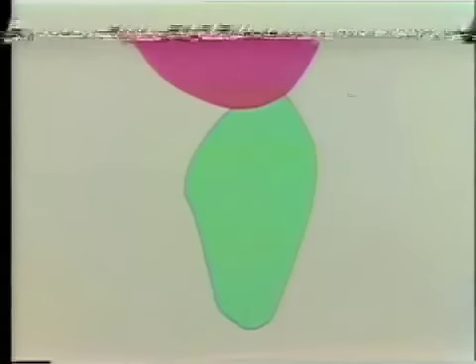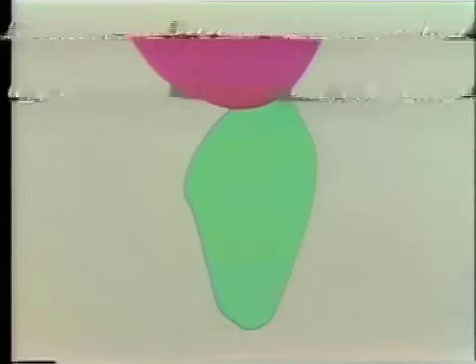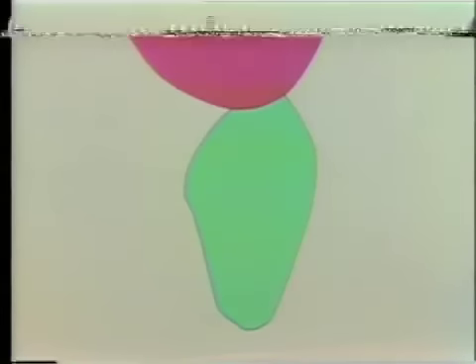Recognizing in this diagram that the right-hand side of the screen is the labial and the left-hand side is the lingual surface, you can see that the Pontic contacts the alveolus from the labial contact just back lingually to the crest of the ridge, and then the Pontic on the lingual surface shoots away clear from that, opening up the lingual embrasure. This results in a minimum contact of Pontic with the mucosa covering the alveolus, and yet sufficient contact there to give good aesthetics in the finished bridge case.